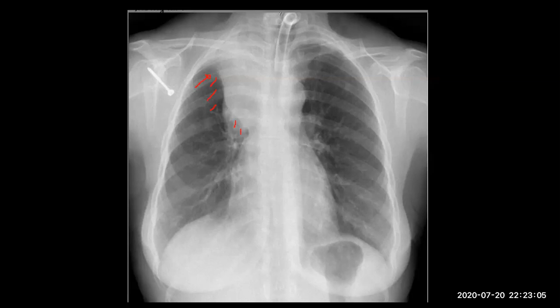Yes, this is the tumor here, and because there is collapse of the right upper lobe, the hilum is elevated, and this is the mass. It is bulging here, and this is the minor fissure. It is here, a little bit convex, and this is the S shape here. This is the Golden S shape.